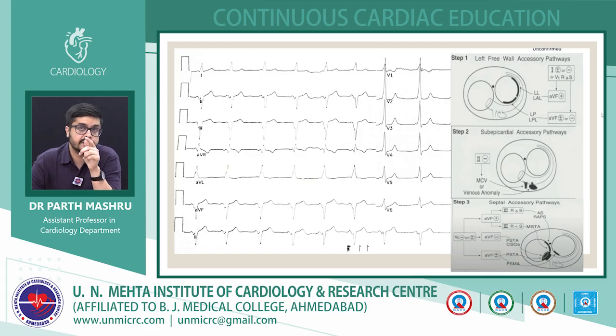If you look at all the steps here, step 2 asks whether lead 2 is negative or not. Here lead 2 is also not completely negative. In step 1 also, lead V1 has no R and S; it is completely positive. You cannot specifically use step 1 in this ECG, nor step 2.